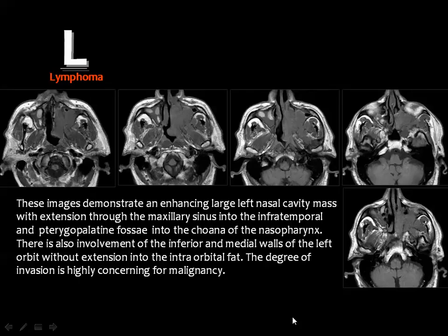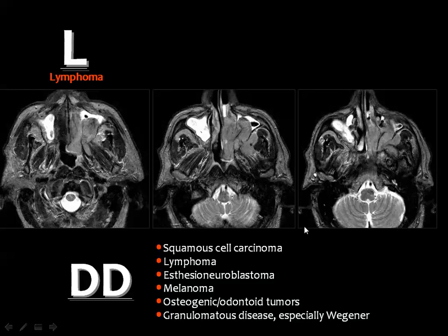And finally, lymphoma also affects the paranasal sinuses. It has been discussed with the anterior skull base, and some of the lesions may extend to involve the middle skull base. And you have seen this example before with the lymphoma infiltrating the maxillary sinus, the nasal cavity, and extending into the infratemporal fossa. And this is the remaining part of the lesion with some retained secretions in the maxillary antra.